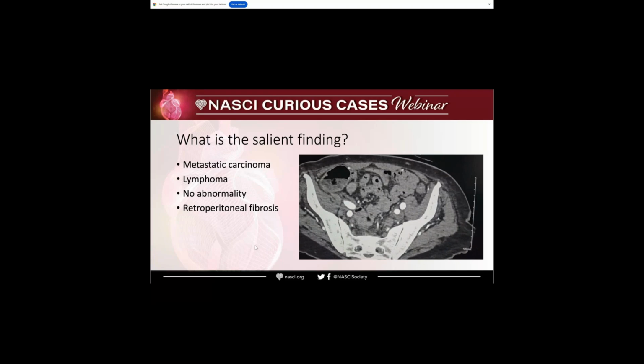I would wonder if this is lymphoma. It just doesn't seem to be narrowing or distorting the vessels, but it's confluent. I don't know. Okay, so what are the options you say? You say it could be lymphoma? I agree, the options are a good differential.